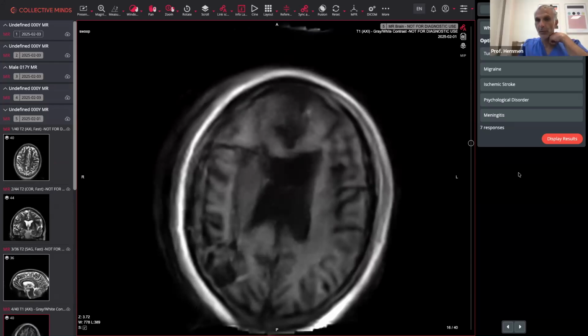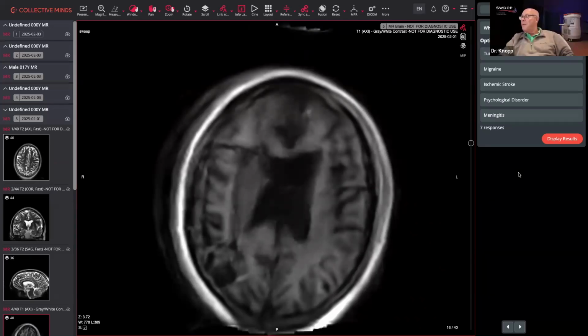Well, I think the first two were just to warm up a bit, right? Oh, okay, fair enough. And we have a potpourri of diagnoses, again confirming that it's maybe not too obvious. Sometimes things aren't quite as obvious and you need further assessment and evaluation, but obtaining something at the bedside in a child such as this, you can rule out certain major things, and maybe you do need additional information.